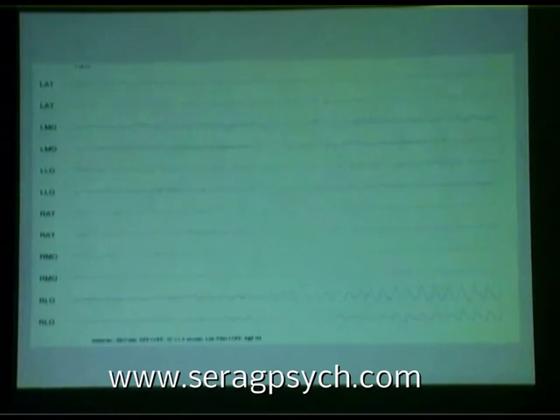Next, please. Oh, this isn't going to do very well. Anyway, it looks like EEG in a fog, but I think we can maintain the principles anyway. This is subdural EEG, and this is background activity. And I think you can see that a seizure is starting here. Nothing happening over here at all.